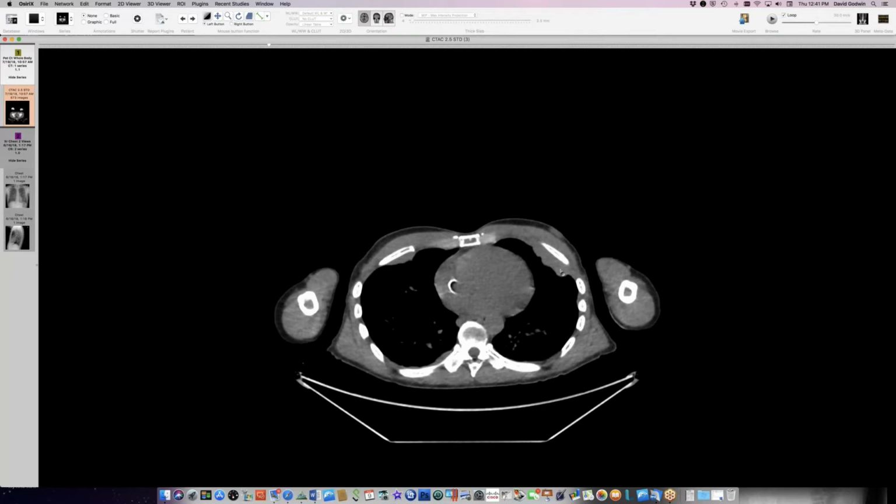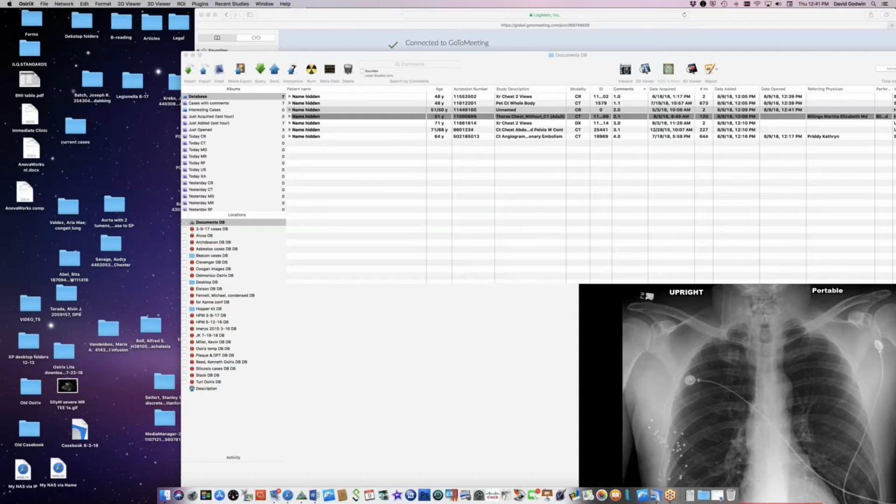And as part of the PET scan, there was modest uptake in this stuff, but it's not bright. So the glucose does get taken up in this, but not as if there were, for instance, metastatic renal cancer again. It's just not that bright on the PET part of the scan. Okay, so extraosseous myeloma or plasmacytomas.